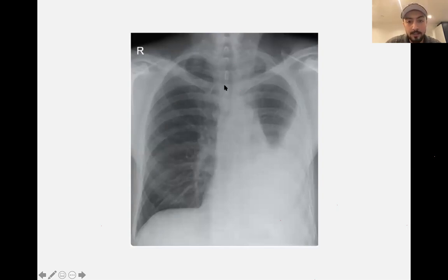So you can see again, let's skip all the name and date of birth and jump into the quality. So you can see the spinous processes are actually in the middle. So I would say the orientation is normal. Maybe you could say it's closer to the left side actually. So it looks like the patient has a slight right orientation, okay?